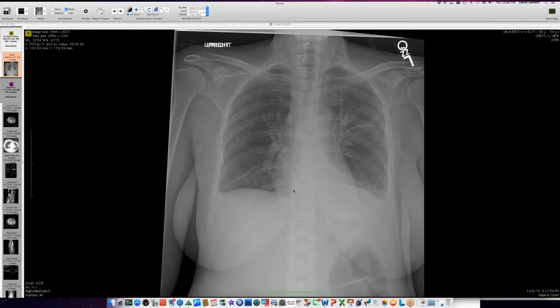This is a Kenyan woman, I think in her 40s, actually 50s, who had some constitutional symptoms, fever, cough, night sweats, has an abnormal chest radiograph here with some consolidation, probably some mediastinal widening here too on the left. And this stripe over here, although it's not convex, is too dense for normal. That suggests that there's some process here on both sides of the mediastinum. Has pleural effusion on this side and smaller pleural effusion here.